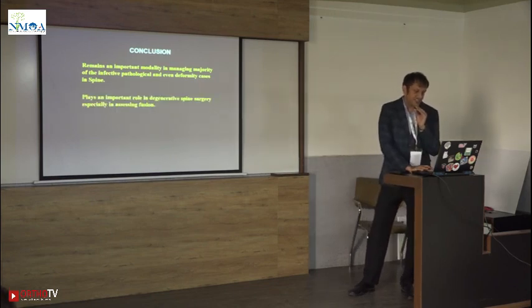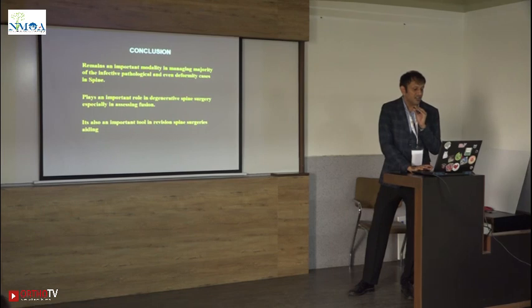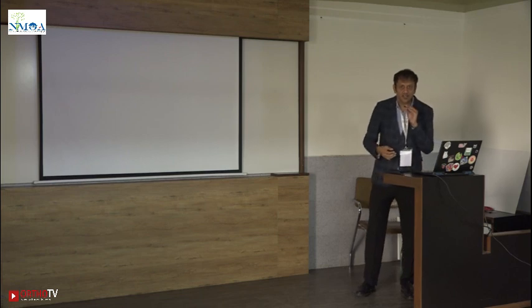CT scan also plays an important role in degenerative spine surgery, especially assessing fusion, all those TLIFs and posterolateral fusions that you do. And it is also an important tool in revision spine surgeries, aiding the surgeon intraoperatively.